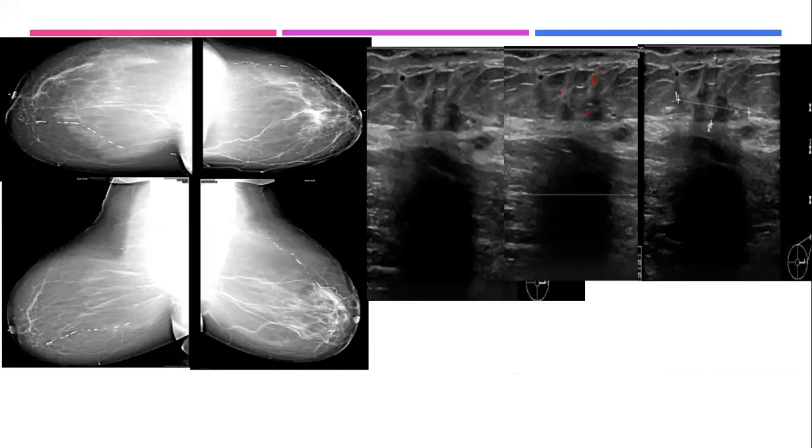This is the 3 o'clock. You see the site of the ulcer. This is the ulcer, and the dermal. It is a very superficial ulcer. That is why they referred the patient to dermatology. There is no infiltrating mass of the underlying dermal layer.